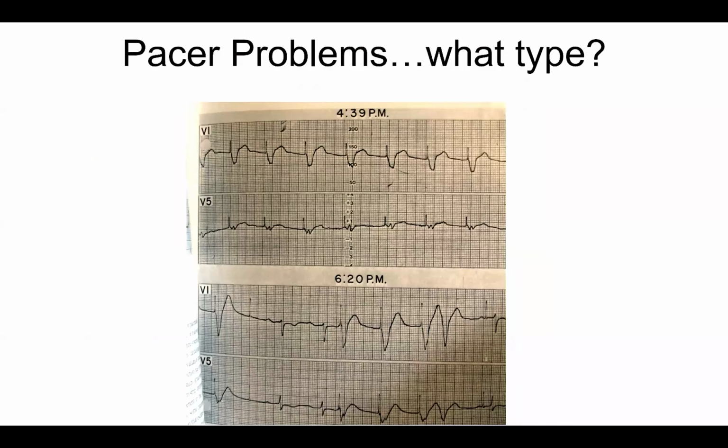Okay. This is an old school Holter on somebody who has a problem with their pacemaker. And maybe you can tell me what is wrong with this pacemaker. Does anybody want to take this one on? So we went from fast now to slow. Why don't we ask Dr. Kaloff if he has any thoughts on this?